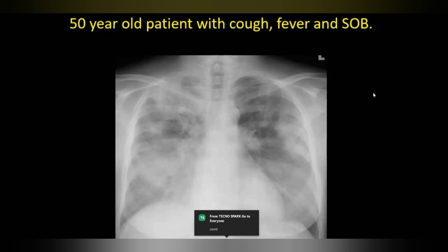Some sort of bronchopneumonia. Would you consider COVID-19? Sir, I considered COVID-19, but in addition to peripheral patches, there are central ones. Nowadays, every pneumonia consolidation like this is COVID-19 until proven otherwise, so be careful. It's indeterminate for COVID-19 as there are central patches as well.